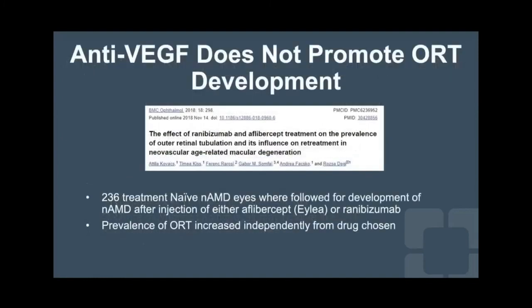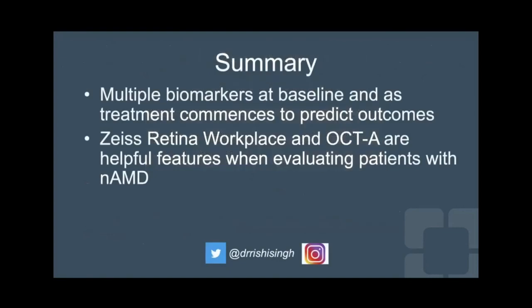This was another study looking at both aflibercept and ranibizumab and compared the two, and really found no difference with ORT development and progression over time. So just to summarize, there are multiple biomarkers at baseline and as treatment commences to predict outcomes in neovascular AMD. ZEISS Retina Workplace and OCT-A are helpful features when evaluating these patients, both at the time of diagnosis and when ongoing management is a necessity.